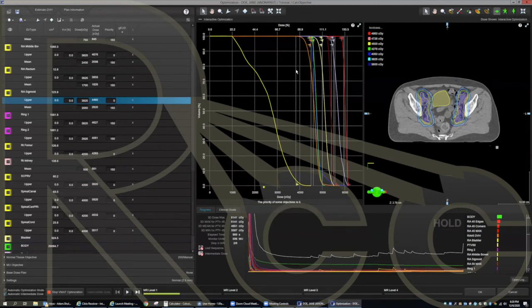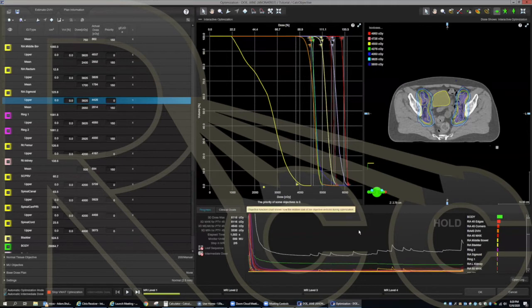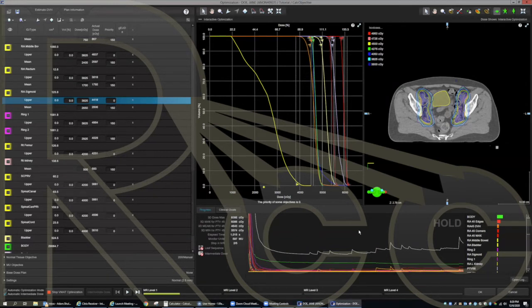Okay, so it gets worse for a second. You can see the error goes up, and that's just because we added more degrees of freedom, and it does an interpolation between the new gantry angles, and that interpolation will be not ideal. So it's going to fine tune in between those original 7 gantry angles, make that interpolation better, and we'll actually get some improvements.